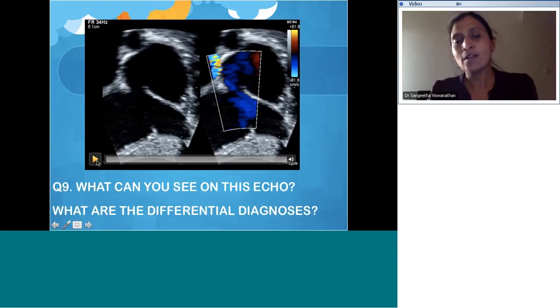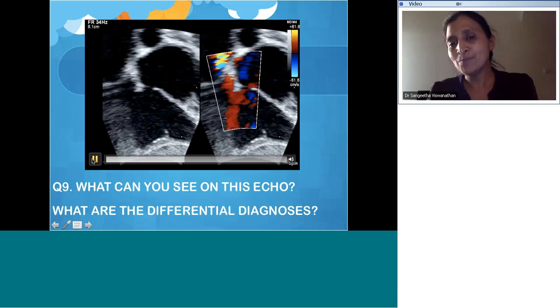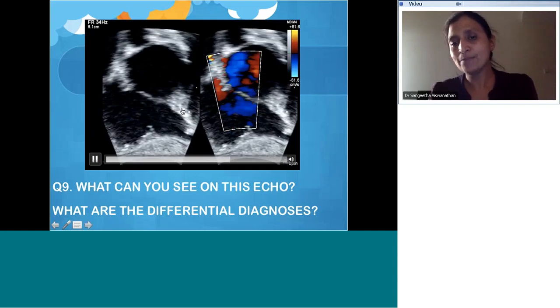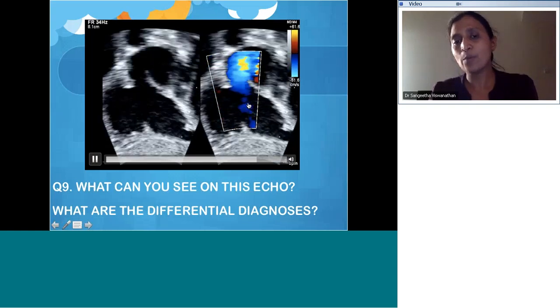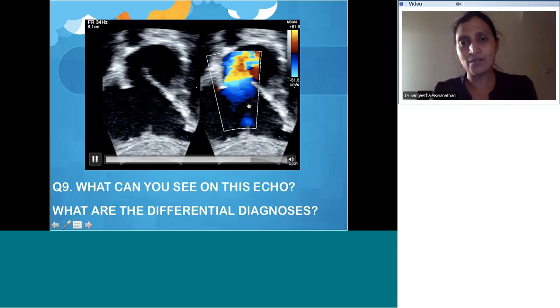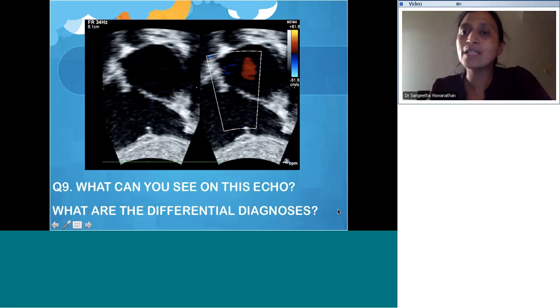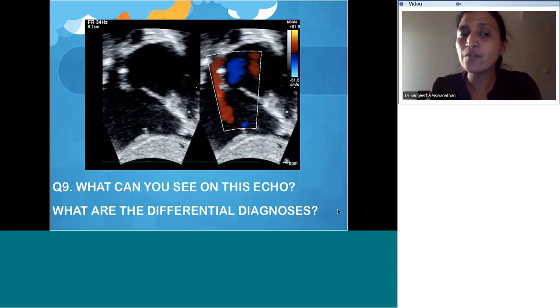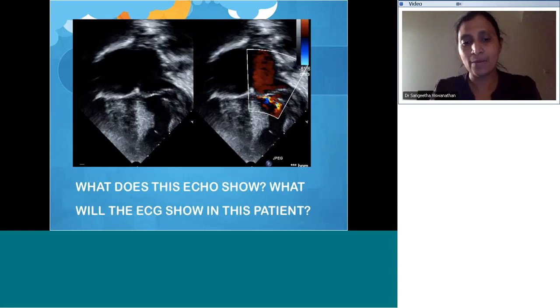Okay, so just a quick one here. What are we seeing here? What am I showing you here? Right, so it's an atrial shunt, which is, what is abnormal about it? Right to left, yes. So just saying PFO is not enough. The striking thing is, an atrial shunt, probably a stretched PFO with the right to left shunt. Now we've already discussed why that happens.